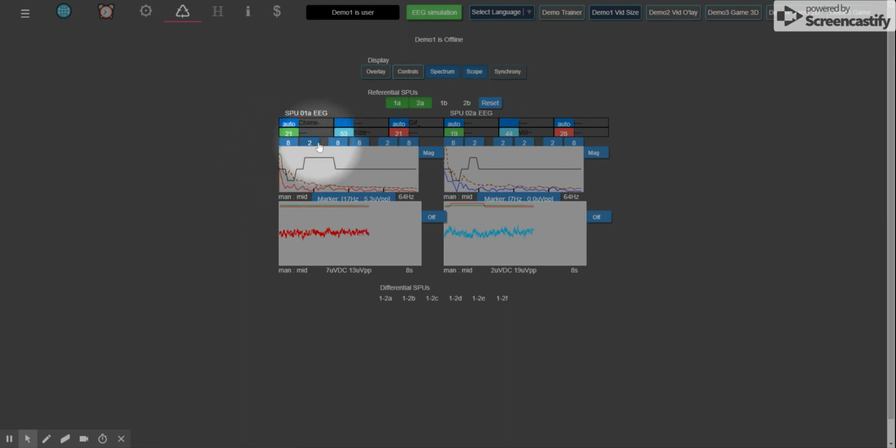Next, we have these numbers here. They're the smoothing filters. In the middle, we have the analog smoothing, so how fast that can change is controlled by this number. The reward, how fast that analog reward changes, is controlled by this number. How fast this analog inhibit changes is controlled by this number. And the one in the middle is controlled by both of them. Generally, it's considered to be in seconds, so it can go up to 32. And 32 seconds is a long time constant. And then that's a fast time constant, a quarter of a second, and you can see it changing more rapidly.